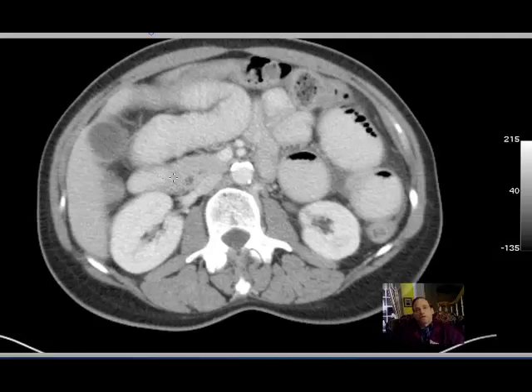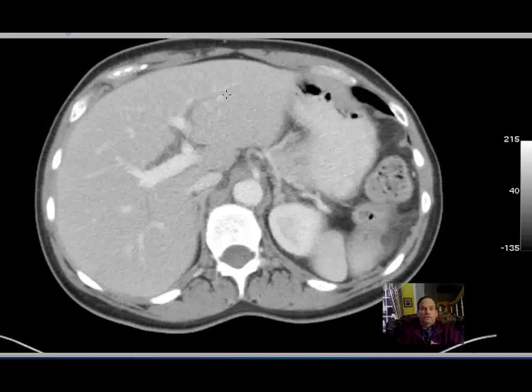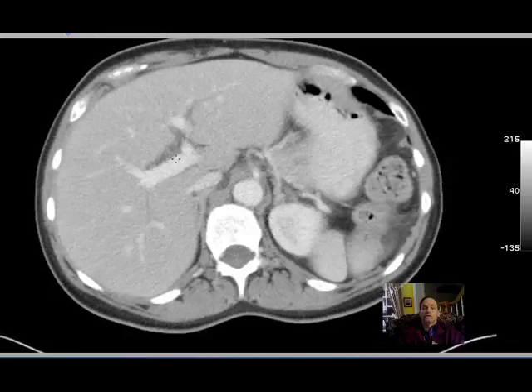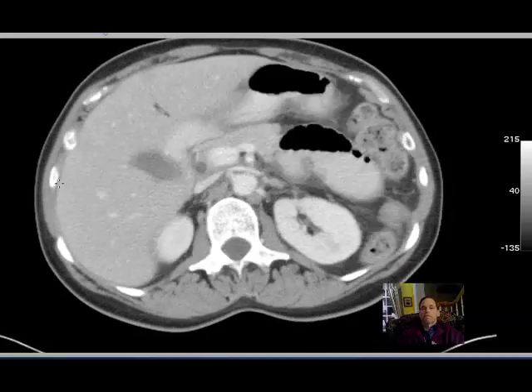It's right about at that level that the common bile duct is emptying into the duodenum. If you have biliary dilatation, you can see that on CT, because if you look here, you follow the portal venous branches, and they have a little thin biliary branch along them right toward the central area, but off more distally, you don't see thin tubular low attenuation structures, which would be dilated bile ducts. If there is biliary dilatation, then you will see these things going out farther, and it can be quite striking. And you'll see an example of that sometime.